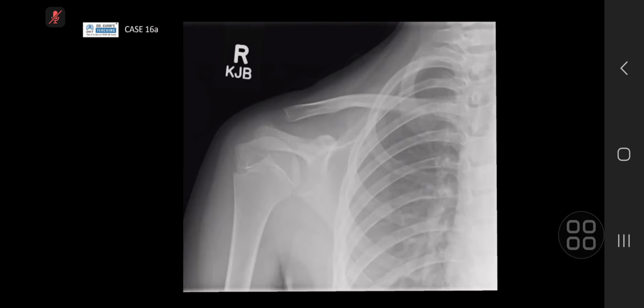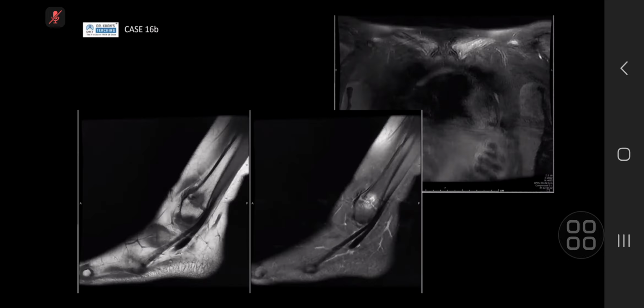Okay, I might see an expansion at the medial aspect of the clavicle, however, no cortical disruption or periosteal reaction. Does the patient have anything else, like rheumatoid arthritis or a known case of anything? Nope. She presented with right-sided pain. Now she also has left-sided pain. So I've got more pictures. Yes, please.